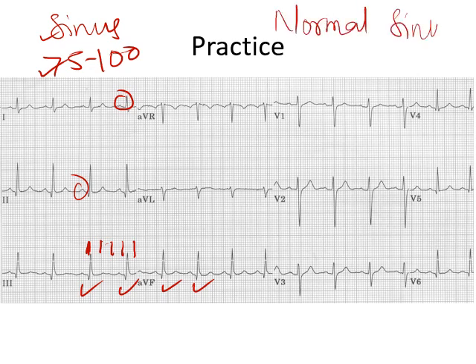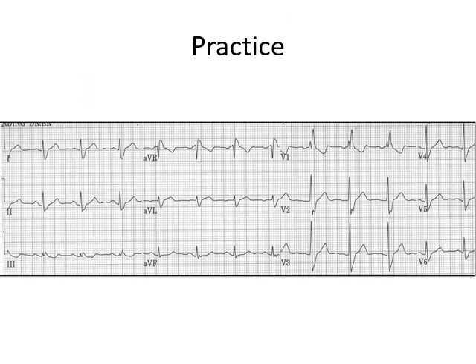So it's essentially a normal ECG. Now let's move on to the next ECG. I will again take a 1 second pause for you guys to figure out the abnormalities of ECG so that you can pause the video and have a look at it.